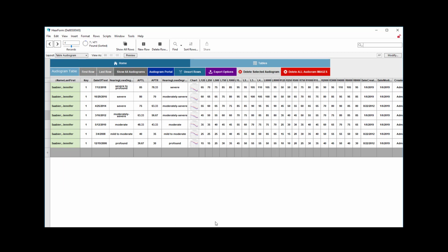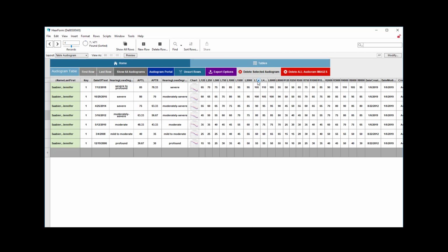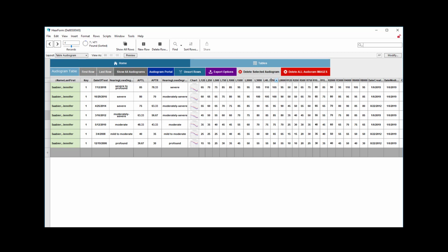But you can see it displayed here, and this may or may not have value depending on what your needs are. You can also stretch a column like this. You can't quite tell that that's left 1500, but if you stretch it a little bit wider, then you can see that if needed. Just keep that in mind. So I'll stretch 4000 and then show you something else here.